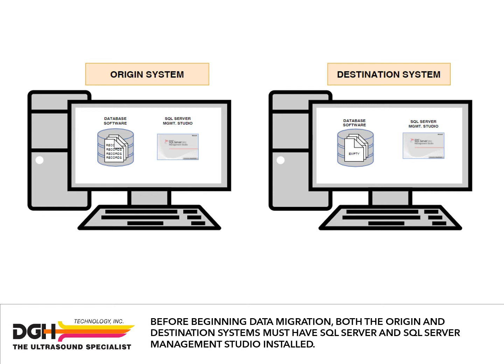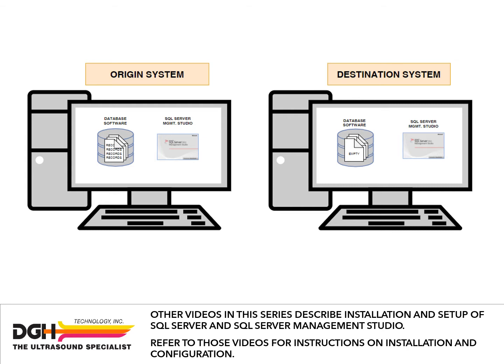Before beginning data migration, both the origin and destination systems must have SQL Server and SQL Server Management Studio installed. Other videos in this series describe installation and setup of SQL Server and SQL Server Management Studio. Refer to those videos for instructions on installation and configuration.